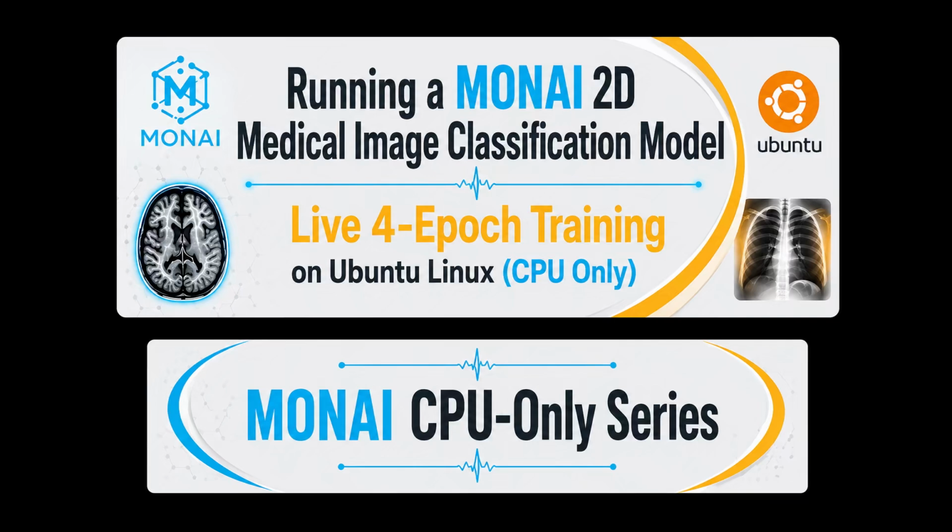In my previous video, I showed that it was possible to train a MONAI 2D medical image classification model on an Ubuntu Linux laptop using only the CPU. But that experiment was limited to just 2 training epochs. Today, I want to take that experiment one step further.